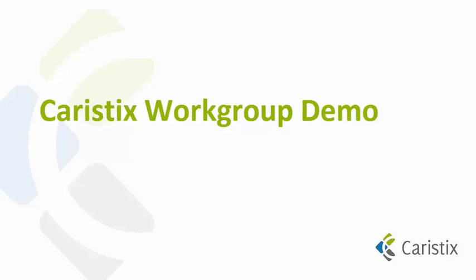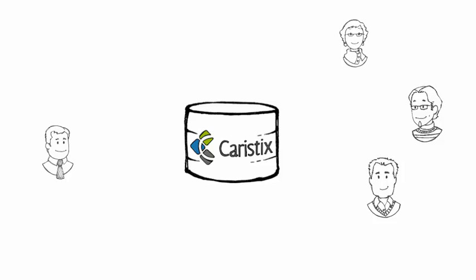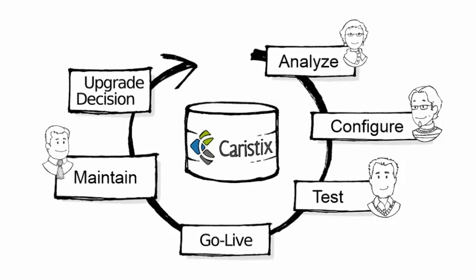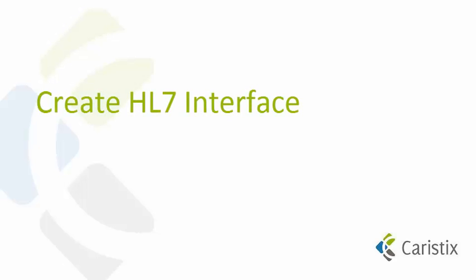Today I'm going to show you a brief overview of the basics of Caristix Workgroup. Workgroup is software that helps interface analysts, developers, and testers build interfaces between health information systems. It's not an interface engine. Instead, it helps your team analyze messages, configure your integration engine, and test and maintain interfaces. For the sake of the demo, we'll create a new HL7 interface.